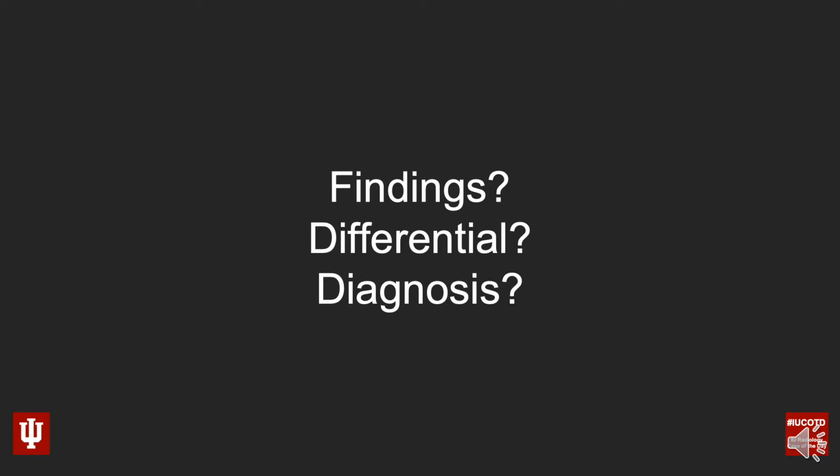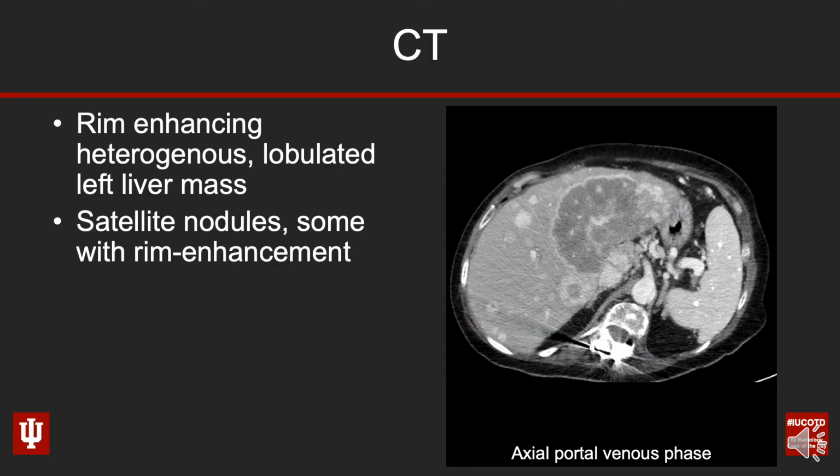Alright, now, what are the findings? What's your differential for this case? And what is your diagnosis? Let's go over the images.